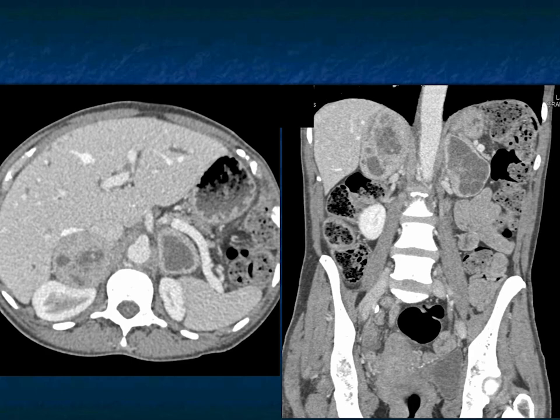They're vascular with renal cell. They can be cystic with renal cell or lung cancer. They can be cystic with melanoma. And it's not uncommon for mets to look different, even in the same patient from right to left. So that's definitely a possibility, okay? What else? What else could it be?